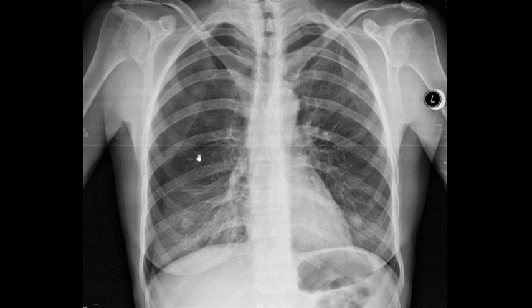Now, if we go to this side, here is the hilum. We now follow these vascular markings, and we see it is very hard to find them, or they are actually not present. We see that this is dark. So this is maybe not the best quality, but any X-ray you look at, even if you look at your first X-rays, if they are lower quality, that is better, because then it will be easier to look at high quality X-rays. So here we can see there is a line.